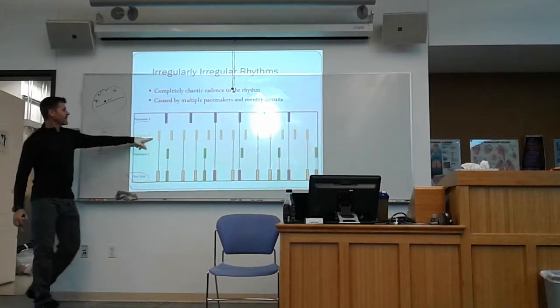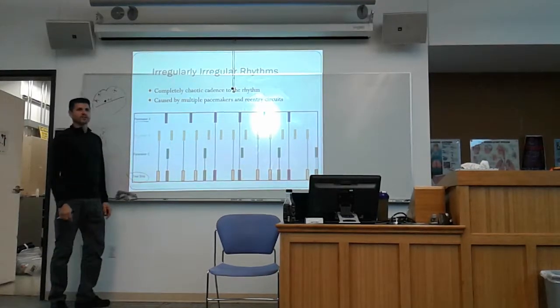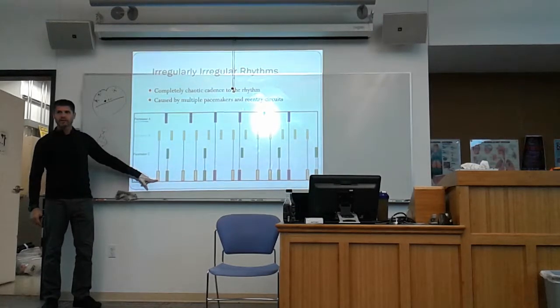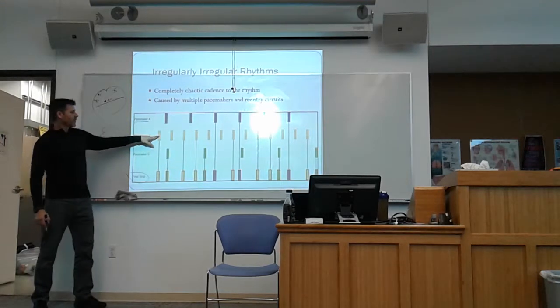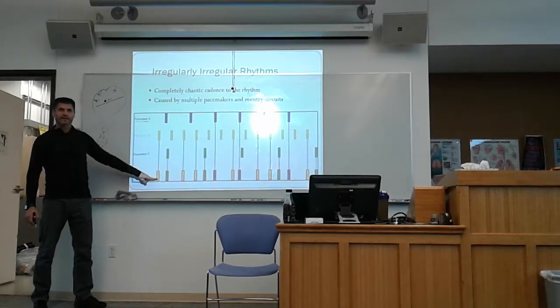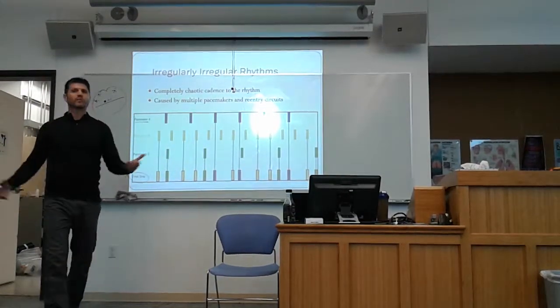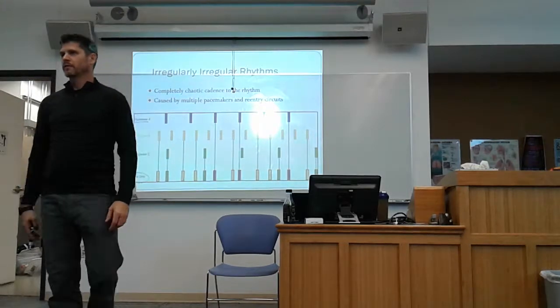Because it got to the AV node, these all represent what the AV node would potentially listen for. This is what the AV node actually sent. So this is a QRS complex. B right here reached the AV node first, and so the AV node fired and sent a signal to the ventricles. We see a QRS complex. Got it? After the AV node depolarizes, what does it go into? It's got its refractory period, right?